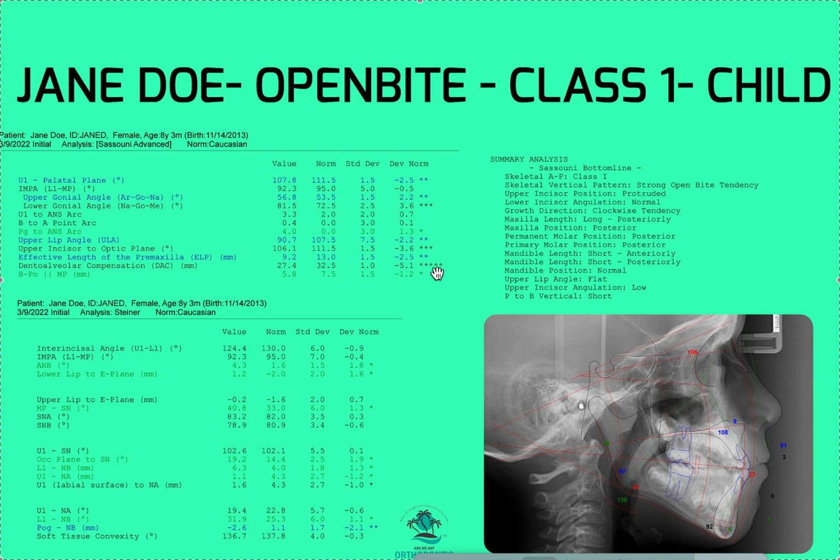So these are pretty much the points that you need to know. Obviously, like I said, what does this mean to me, with all these different stars and standard deviations and everything? Well, it's telling me this patient has a growth pattern that is not good. It's a long face growth pattern, a steeper growth pattern, and we need to fix the airway so that we know what to do. Like I said, you can totally see this is a tiny airway here. Obviously, my guess is something's going on with the nose in terms of obstruction. Maybe this patient has allergies. Maybe this patient has oral habits. So we need to dig in and get a little more information so that we can create our treatment plan. But this Ceph basically confirms what I'm seeing probably on the patient.